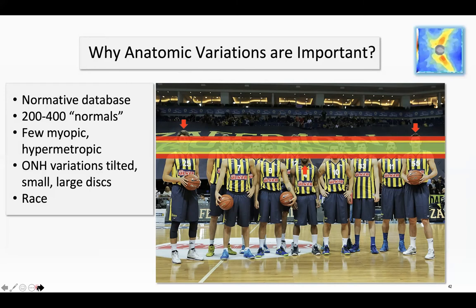That's what happens in OCT. The same thing happens when the OCT compares the patient's results with the normative databases. If the values do not fit the normal range, then they will be flagged red as abnormal. This does not mean there is damage every time. I want to show some common examples.